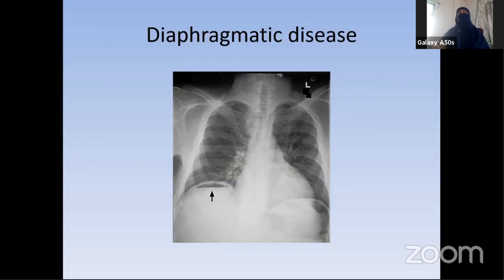Now some slides relating to the hemi diaphragm we can go through. This is a chest X-ray PA view. Why is it a PA view? We have learned earlier that whenever there is a PA film, the clavicles will be oblique and the medial ends of the clavicle will be at the level of the fourth rib posteriorly, and the ribs are more obliquely placed, and the scapulae are outside the lung fields, etc. From all those prerequisites, we can say this is a PA film.